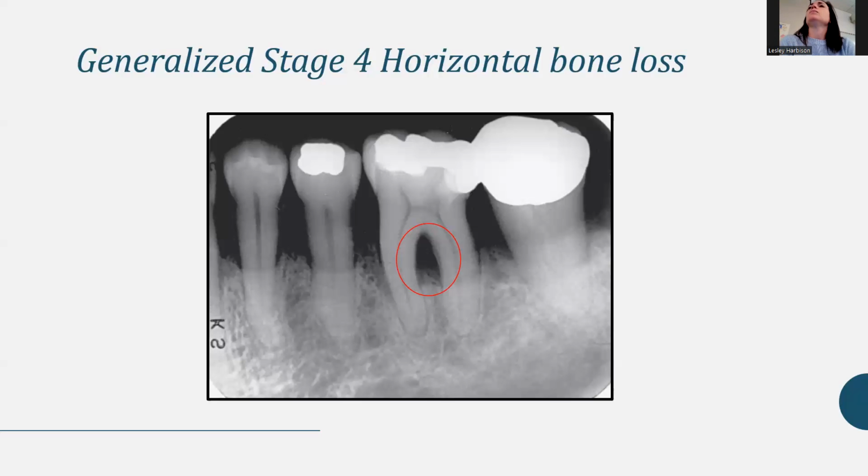Is this only in the stage of disease, or when they're controlled periodontal disease and I still have this much bone loss, they're not going to go back together? Yeah, they're always at that stage, even if they're on their maintenance. Yeah, that's a good point. Even if they're stable, they're still staged.